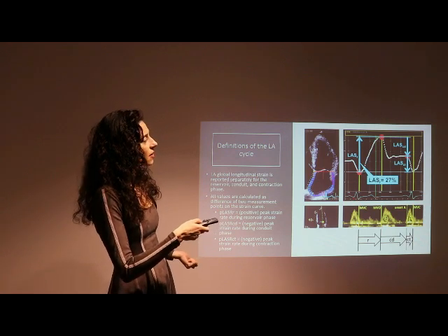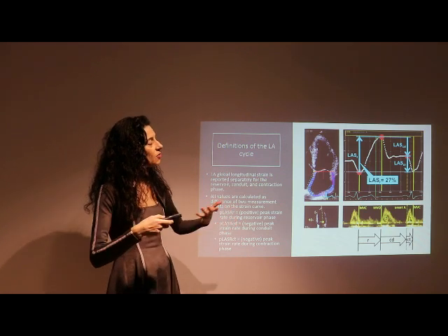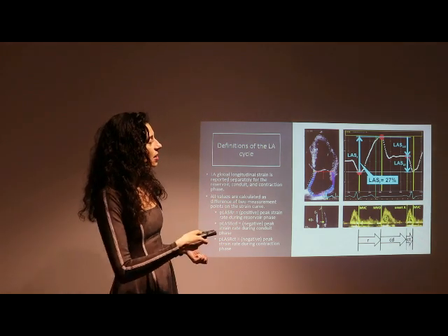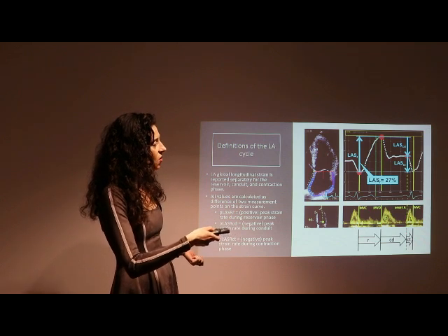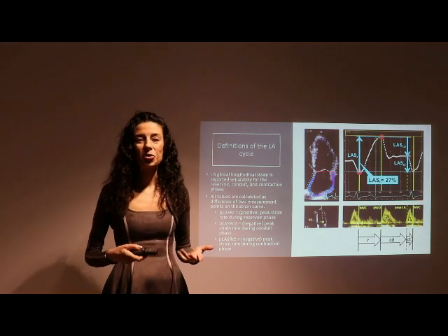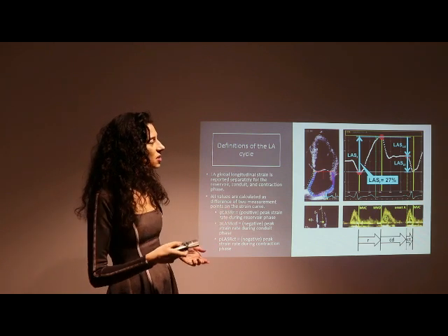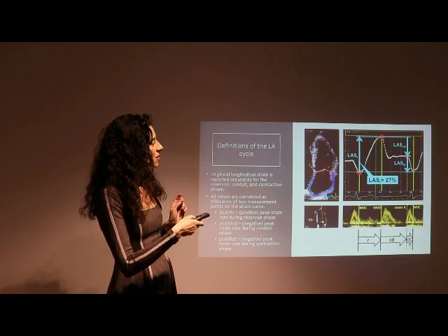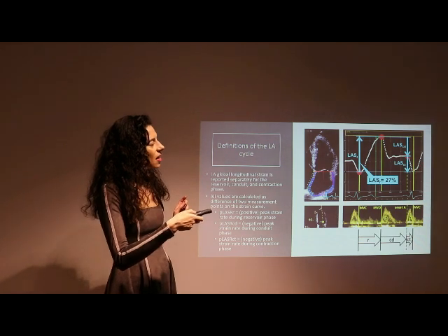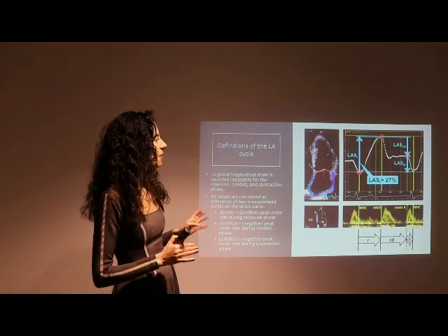Also, the contraction, the last phase of the deformation of the left atrium during diastole, is better determined by the onset of the A wave than by the onset of the P wave on the ECG, which is not so exact. Also, of course, if you have a good strain curve, you could see very well where the strain curve goes from negative to positive and changes its direction, so you can determine these very useful time points.